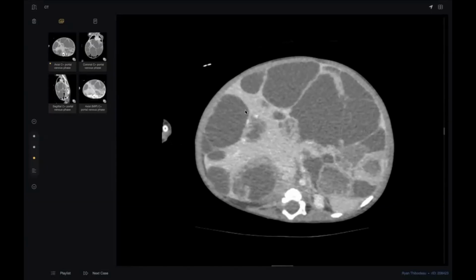Sir, was there any arterial phase available? I need to look for any arterial enhancement to say. Unfortunately, no. Okay, then I will suggest further alpha-fetoprotein or PIVKA-II correlation to rule out hepatoblastoma, and MRI may be helpful.